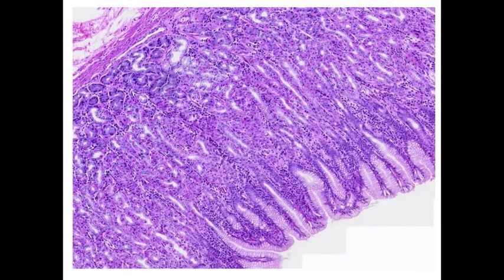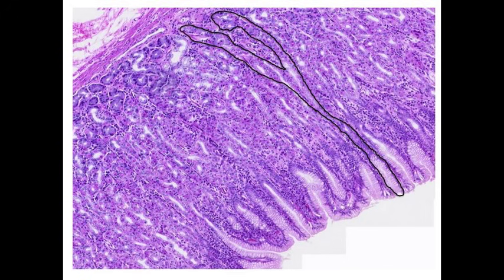The most prominent glands in the gastric mucosa are the fundic glands, which are shown here. These simple branched tubular glands in the lamina propria consist of an isthmus, which connects the gastric pit to the gland. However, it is often difficult to distinguish on H&E preparations. The gland itself consists of the neck and fundus region.